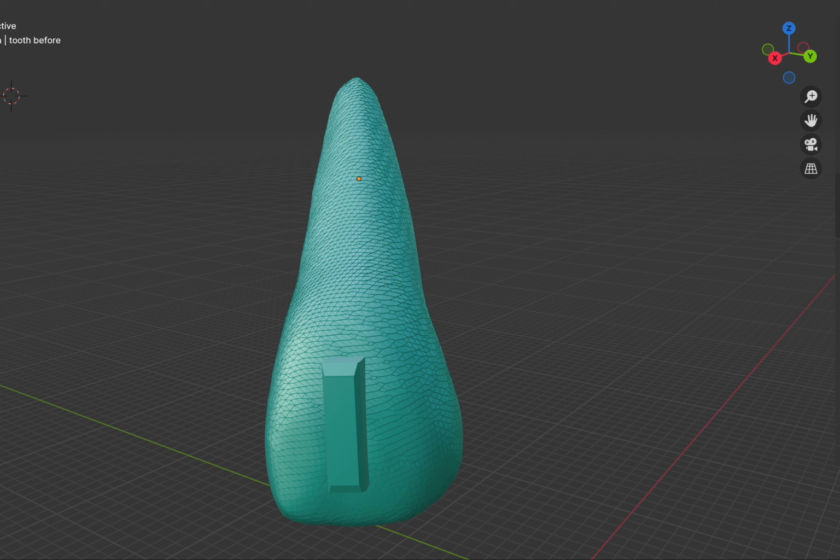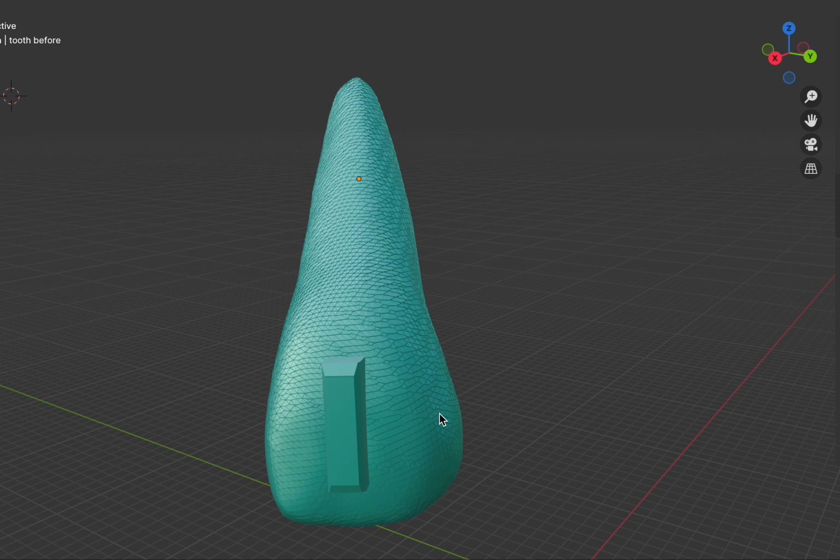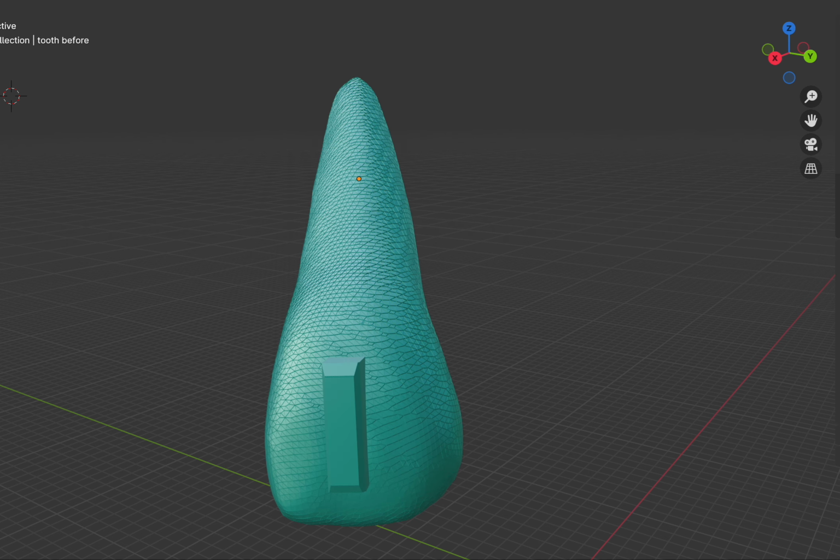So this is the position that we wish to attain with an aligner, and then keep on going more and more towards a translation. And what happens is we have about a 0.2 to 0.3 millimeter difference. The attachment has been moved, and the way to be able to get to this position is to create an aligner.